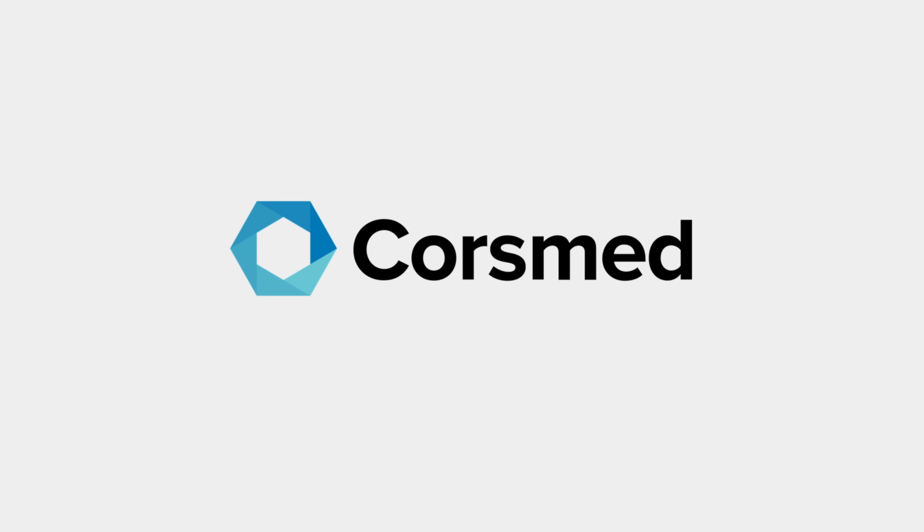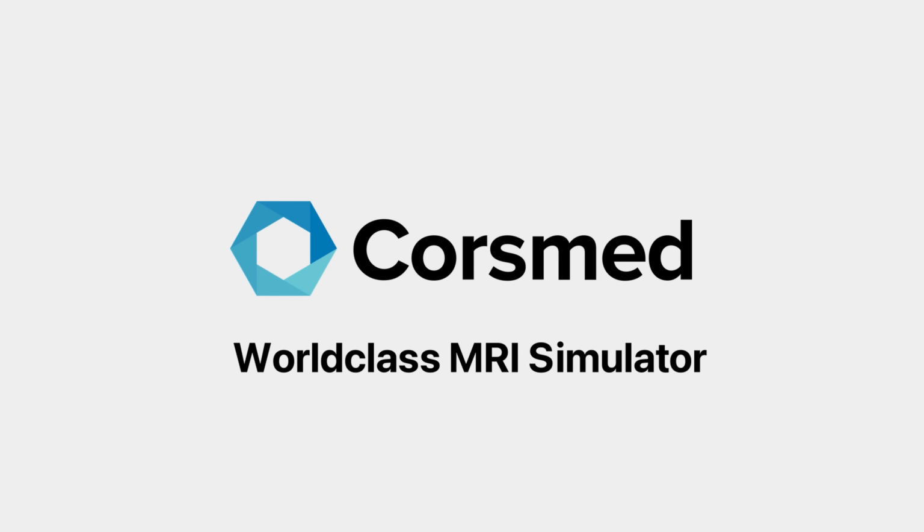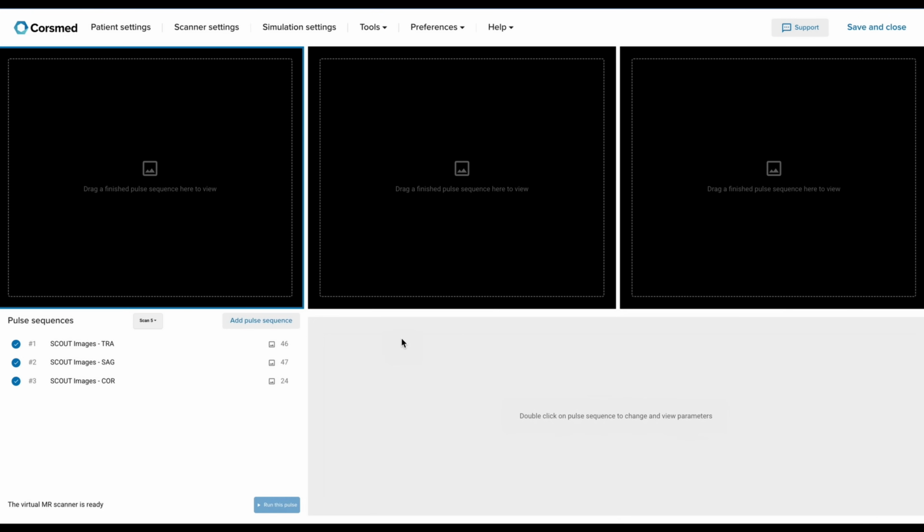Today's topic and protocol is the anal fistula. We're going to do the entire thing start to finish inside the Corsmed MRI simulator. So going over to the simulator and let's go. Here we have the Corsmed MRI simulator, which is the tool I'll use to showcase this protocol.